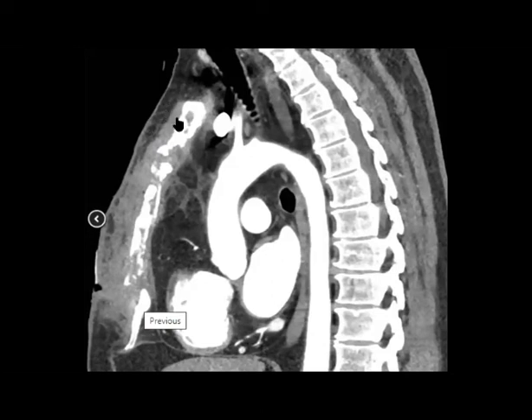When you describe it, describe the bony changes with permeative and destructive pattern. Nice. And don't forget the soft tissue. You can see that the skin here is denuded or discontinuous. Perfect. And there is fat smudging and stranding.